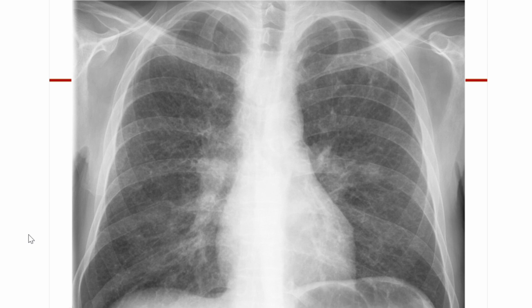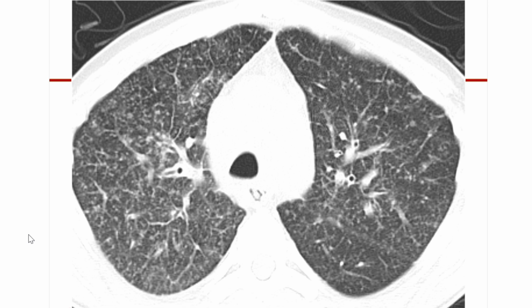What about miliary TB? We know that with miliary TB, oftentimes the x-ray looks almost normal, and it can be very tough for us to decide that there are little nodules here, all right? So there's no shame in missing miliary TB completely, unless you were to say, oh, I think I see something here, and maybe it's like hazy ground glass, all right? But my colleague who practiced during the AIDS epidemic in the 80s, he took one look at this, and he was a neuroradiologist, and he goes, this is miliary TB in an AIDS patient. I'm like, come on, I don't see anything, all right? And he was right, because look, this is the patient's CT scan, and you can see the beautiful miliary nodules studding the fissures and studding the subpleural surfaces, all right?